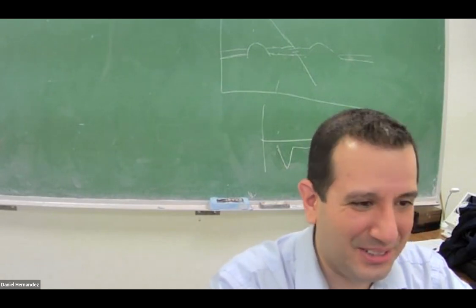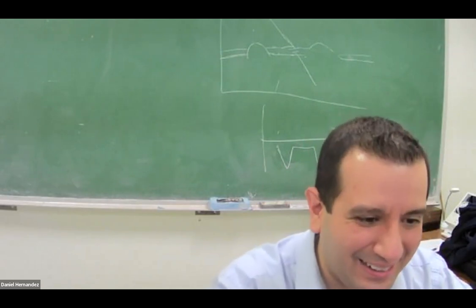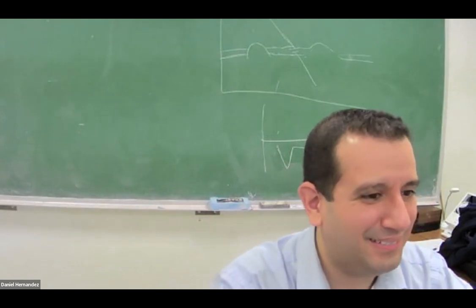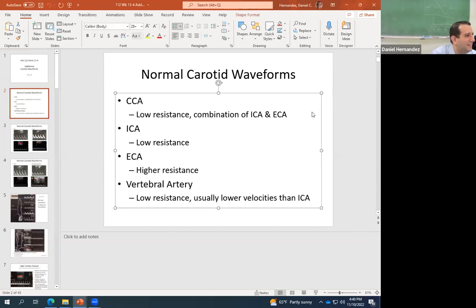This one's easy. This is just looking at waveform pictures. Is it an ECA? Is it an ICA? Share screen. Which lecture is it? 13.4, additional waveforms.